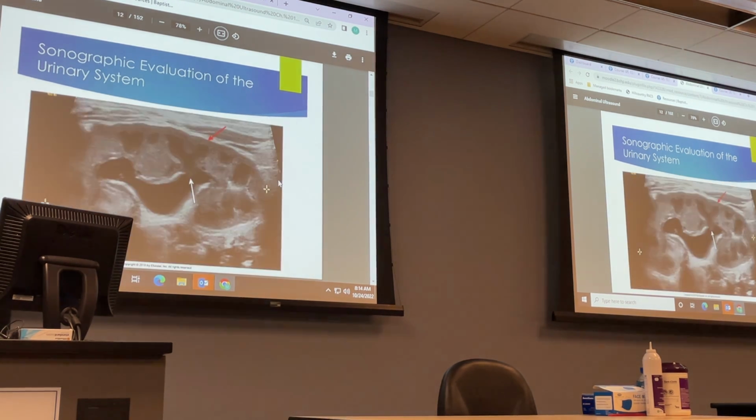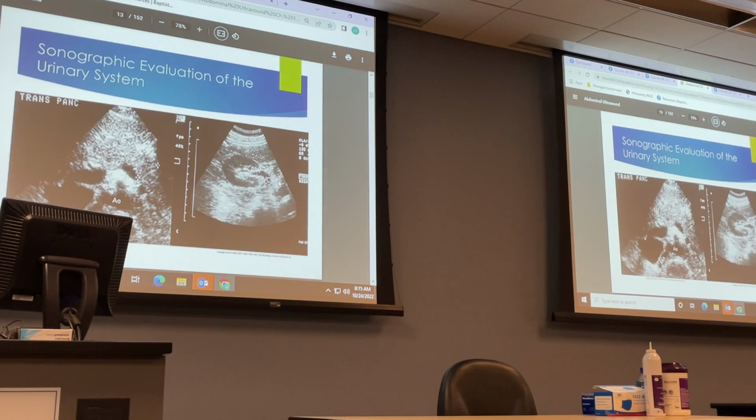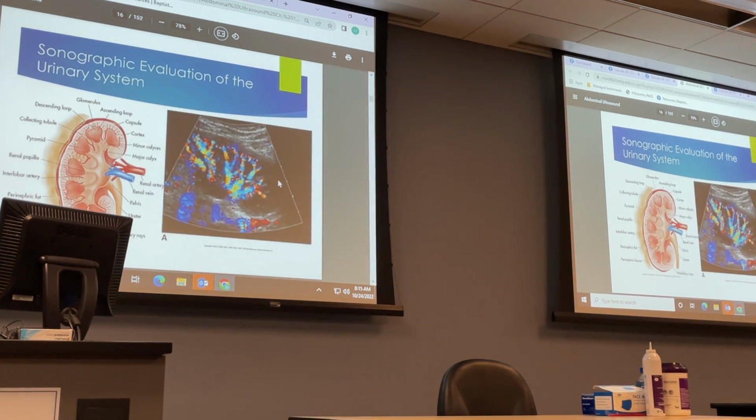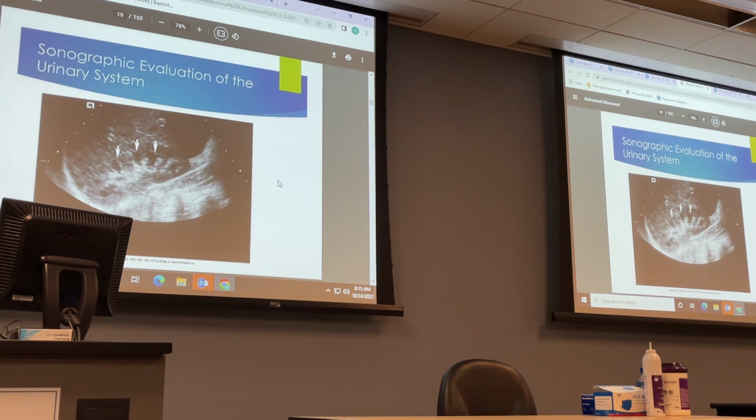I'm going to skip over these because these are just showing you again your normal examples. What are those hypoechoic structures right there? Those are pyramids.